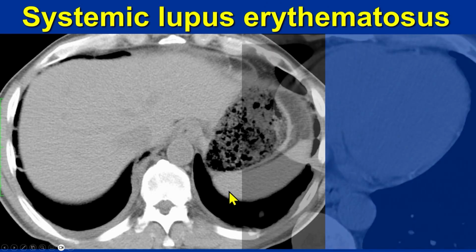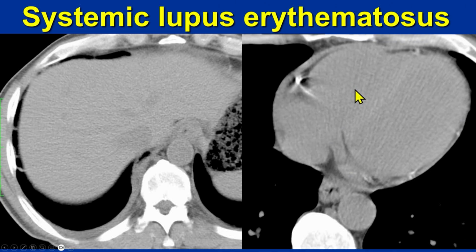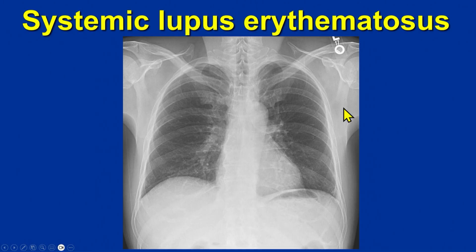Okay, so here's a patient with bilateral pleural thickening, as you can see, patient with lupus. It's a pretty common manifestation here. We look at the pericardium, there's also pericardial thickening. So examples of chronic serositis or healed serositis. Here's another patient with lupus.